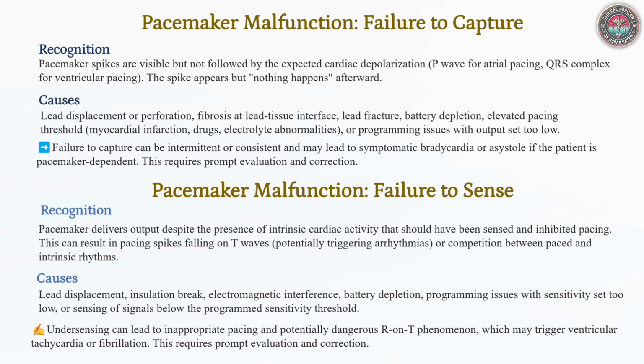Pacemaker malfunctions. Failure to sense. Failure to sense occurs when the pacemaker does not detect intrinsic cardiac activity and continues to deliver pacing impulses inappropriately. This can result in pacing spikes falling within native QRS complexes or on T waves, potentially triggering ventricular arrhythmias.